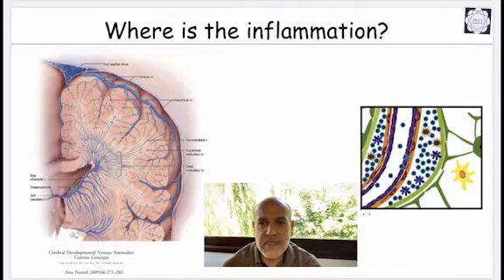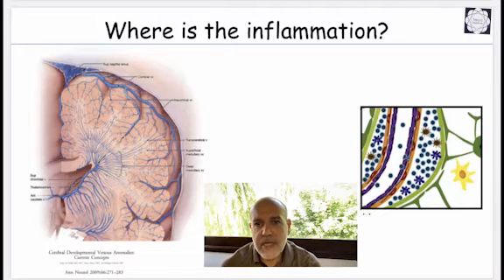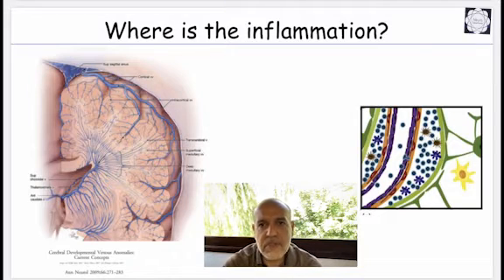You can see here the deep and superficial medullary veins, and some of them are transcerebral. So if we make a slice at the cross-section of these vessels, we will find a punctate or sand-like pattern. If we perform a slice along the longitudinal axis, we will find a striated pattern.